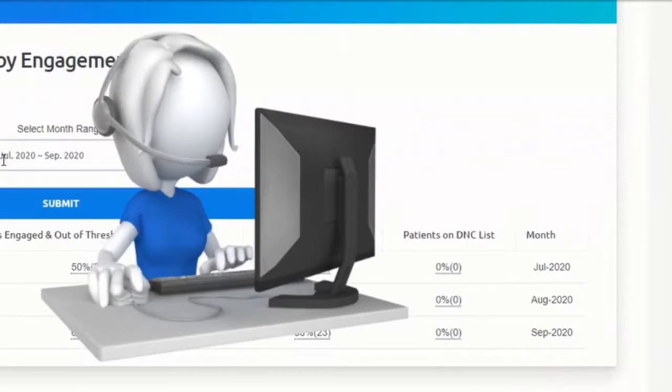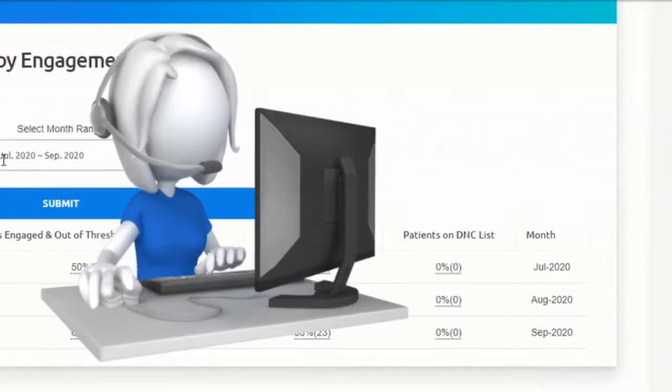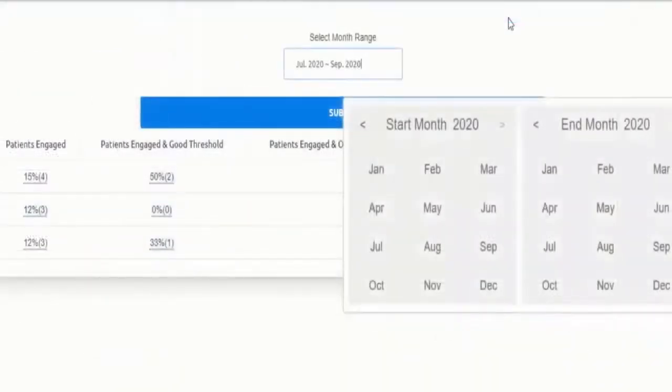The Visit Their Profile option will open a new screen and take you to the patient's individual stats with the option to start a patient monitoring session, all within the same date range you pulled from the population data menu.